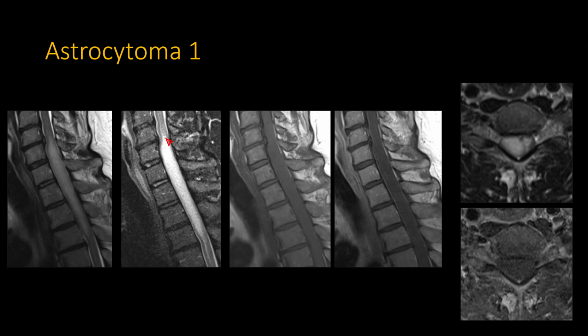you should be able to tell that you're also dealing with potentially a neoplasm as opposed to an actual inflammatory process. On the actual images, you can also say that perhaps there's something encapsulated here as opposed to just a diffuse, ill-defined inflammatory process.